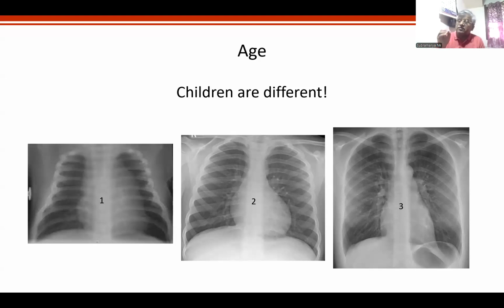That means, first of all, the chest of a child is compromised. What does that mean radiologically to me? Radiologically, it means there is restriction of the spaces and a lot of overlap of structures, and the thymus occupies a large part of the chest.